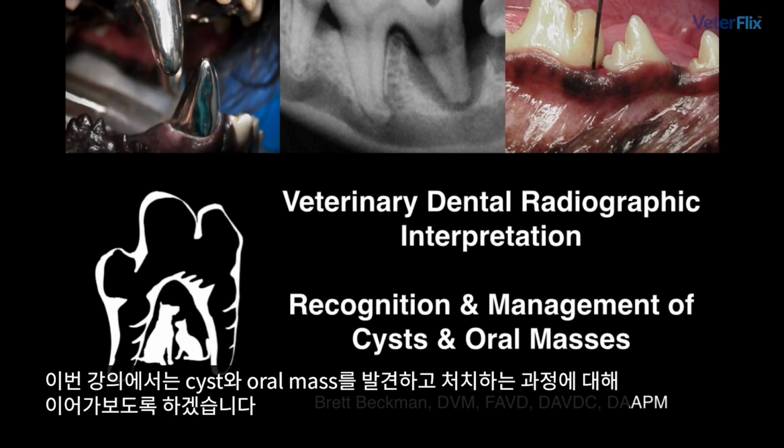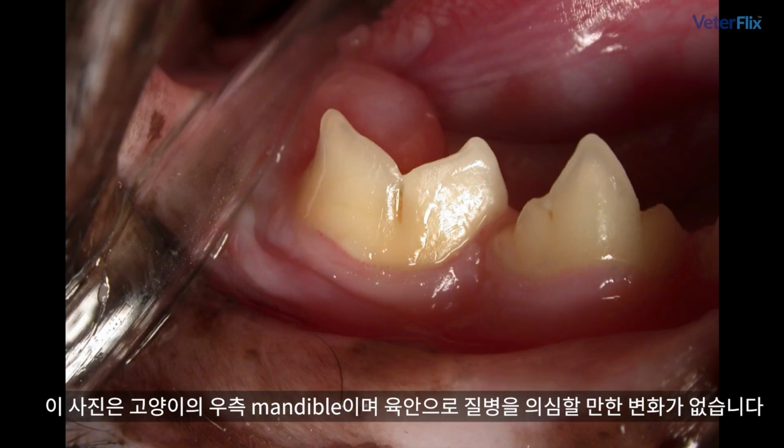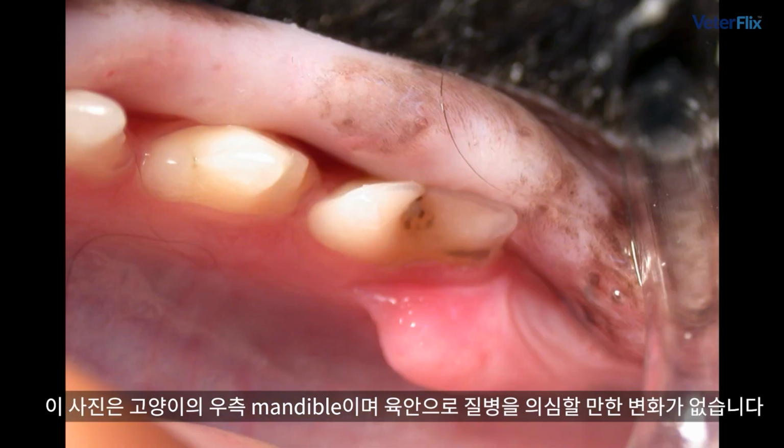We continue our course on veterinary dental radiographic interpretation with a segment on recognizing and managing cysts and oral masses. This is an image of the right mandible of a cat. No gross changes are present here. No changes that we would suspect disease.